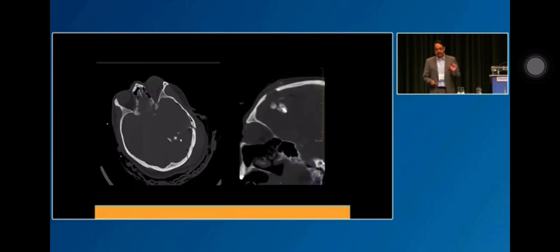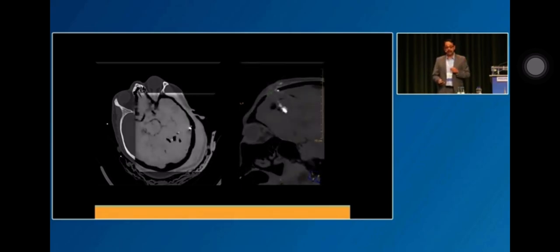Now, one interesting use of calcium suppression is in separating bullet fragments from bone fragments. So these are two separate gunshots to the head, and you apply calcium suppression, and the bone suppresses, goes black, and the bullet remains white. I hope you don't see much of this here. I see this every day, so I need to get good at it.